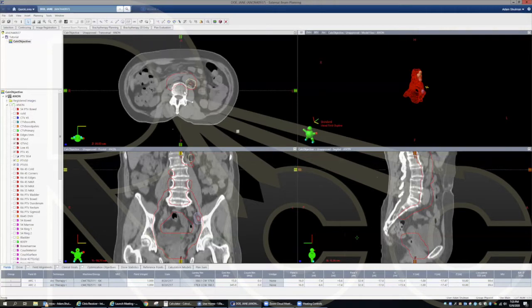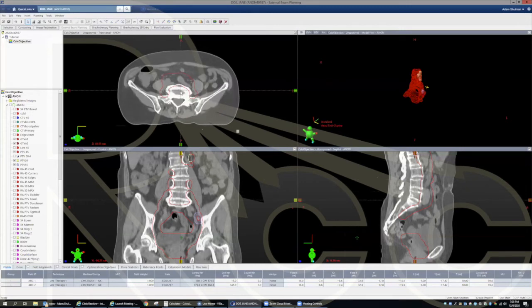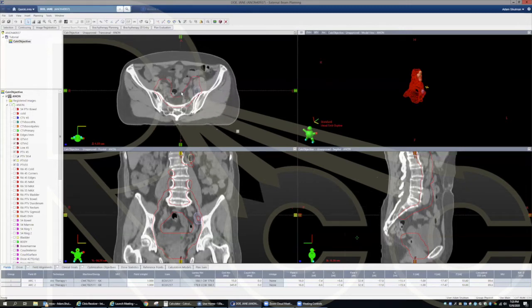All right, so I'm going to be planning by a particular method, which will be covered in the RCC curriculum in the PowerPoint presentations covered by Cesar. And the idea with this method is that hopefully, if we design our contours properly and don't have any conflicting arguments, we'll be able to get the plan done to a high quality within 1 iteration. At most, I'd like to see 2 iterations. Now, it's been about a year since I've planned, so bear with me if it doesn't go quite as planned, but here we go. So I'll discuss a little bit about the contours.